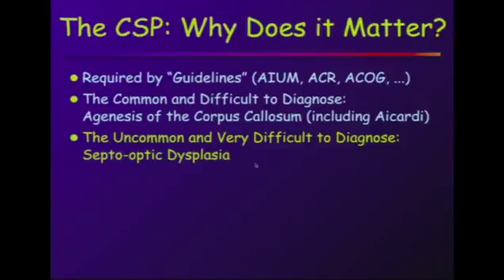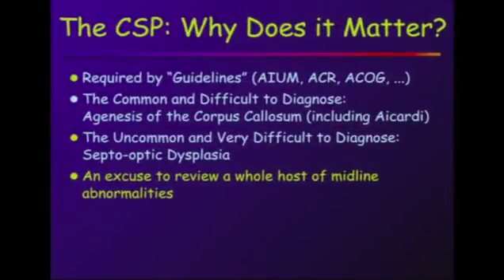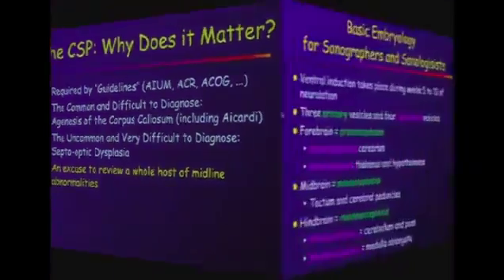And in the last 12 minutes right here, let's talk about a whole host of midline abnormalities. We don't need absence of the CSP to make this diagnosis because there's a lot more going on, but it's a nice way to review, a vehicle, if you will, to review midline anatomy.